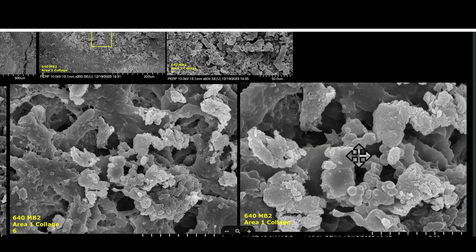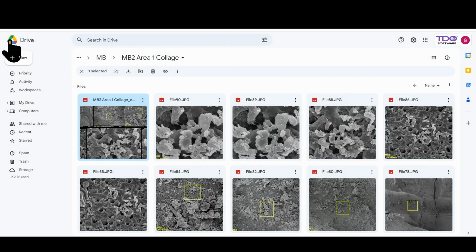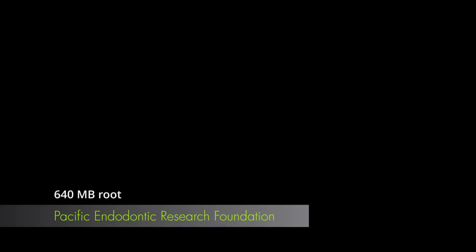I will say that in looking at this case, even though it was necrotic and very infected, I was not able to find any bacterial morphotypes at all.